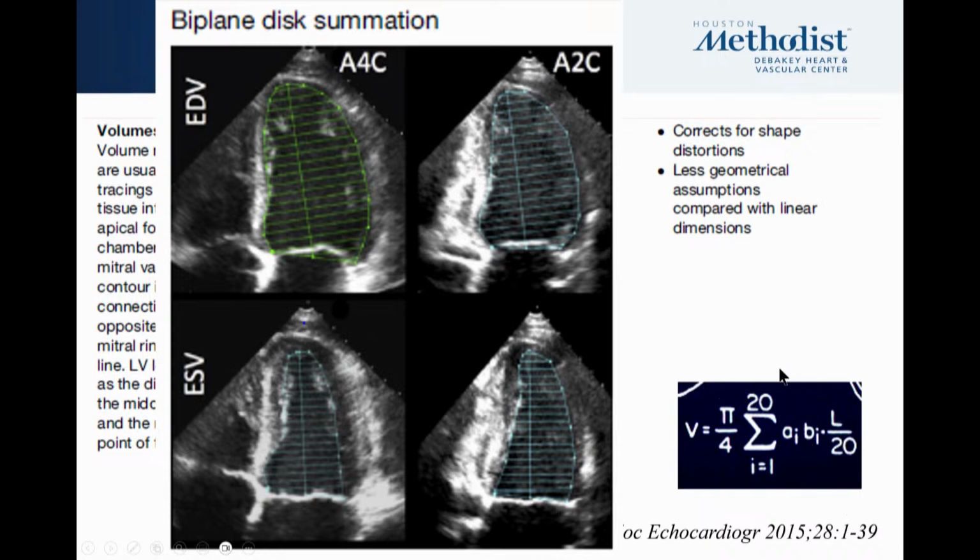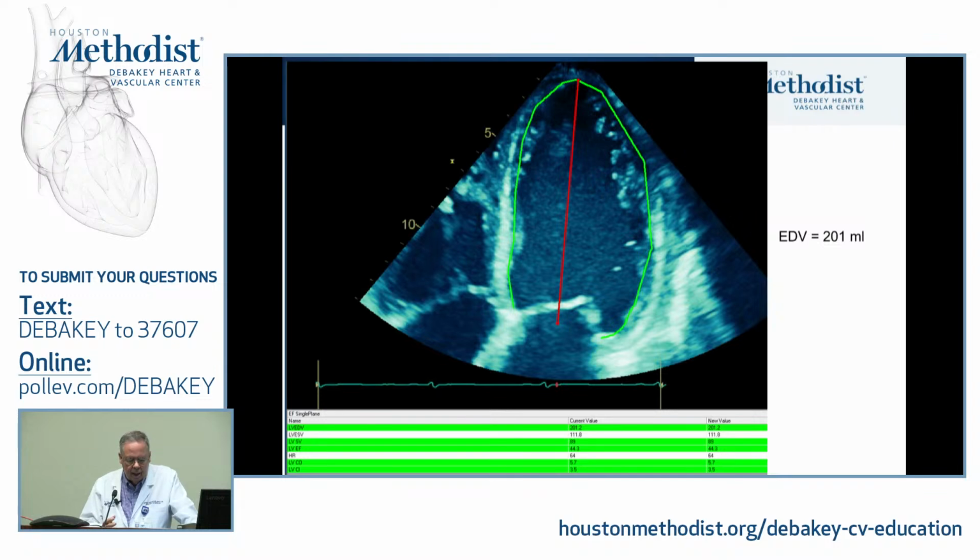We will not ask you to memorize it, and I can tell you the ASE exam will not ask you to know that formula either. And it would be impossible, or it would take you one day to do one case manually. But computers love numbers and formulas. So this happens very quickly when you do it in the system. Now, therefore, the trick is not the mathematics. The trick is how to trace.